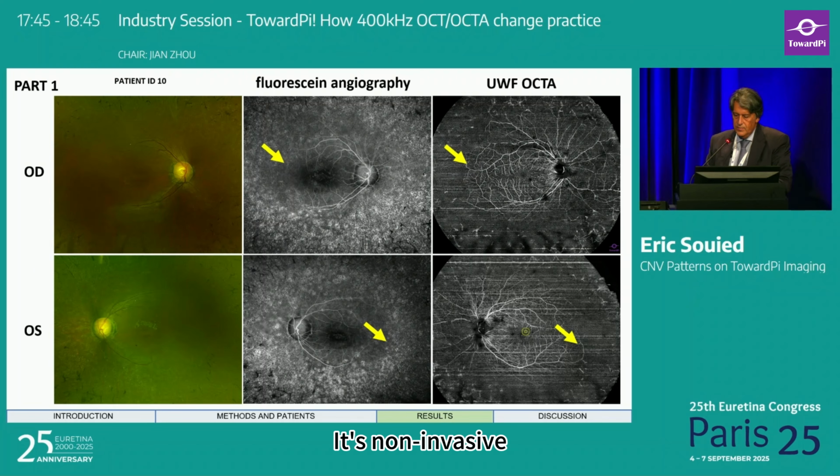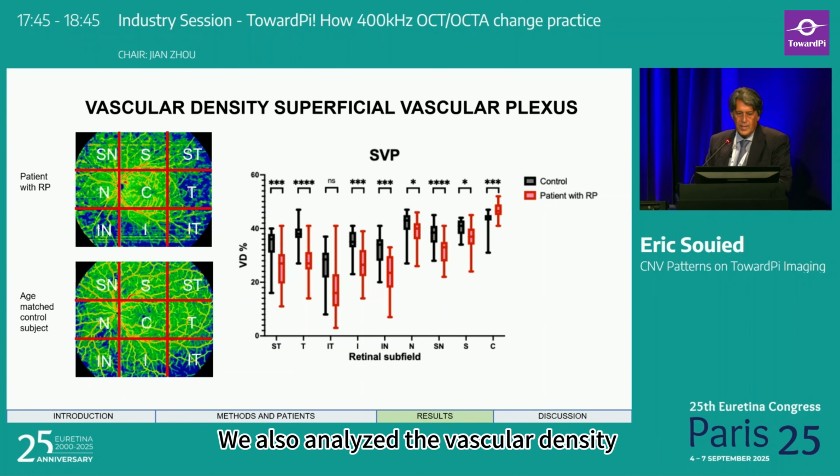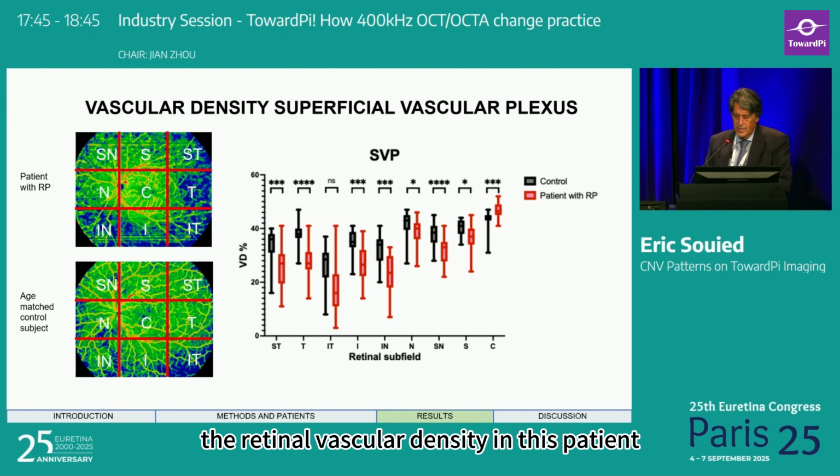It's non-invasive, it is acceptable to the patient, and we can see the non-perfusion or the hypoperfusion in this patient. We also analyzed the vascular density, choroidal density, but also the retinal vascular density in this patient.